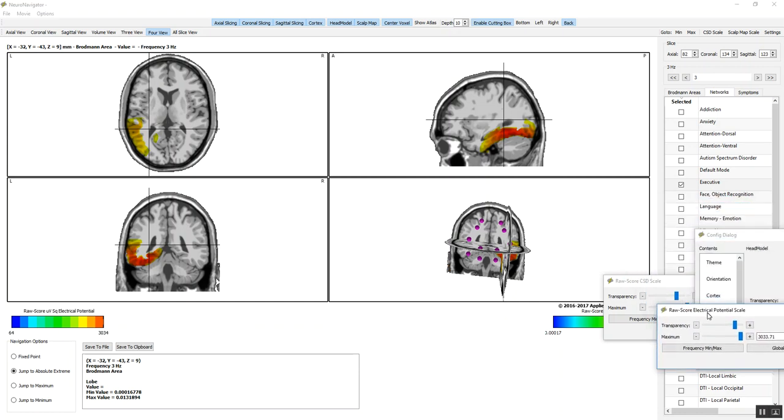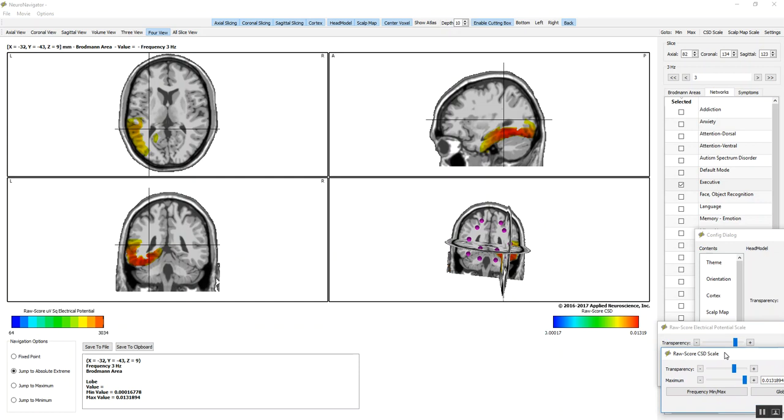When I was at the National Institutes of Health, I was a 128 channel EEG recording manager, I was in charge of the program, and we integrated EEG, 128 channel EEG, 19 channel, 32, 64, 256, with functional MRI and PET scans. And over the years, these different networks were studied and confirmed using these different imaging modalities. Here we can show the Brodmann area outlines.